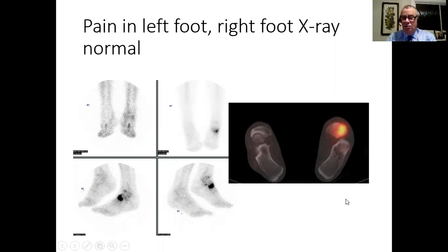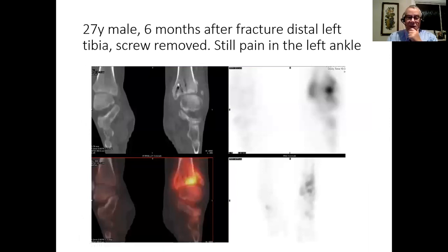Again, the X-ray was normal. So this is slightly unusual. It looks a bit like a knee, but this is actually a coronal view of the ankle. And again, this is after a fracture. You can see that they've taken out the screw that put the medial malleolus back on, but somewhere along the line, they forgot to check the lateral malleolus. And there's a bit of an avulsion there, but even more subtle.